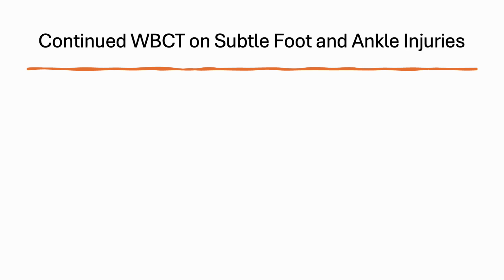What are we really looking for in these subtle injuries? I'm looking at the translation, the rotation, and the area. Those are the three things that I have found in my practice that really make a difference. Is the fibula sitting where it's supposed to be? Is it rotated differently? And then comparing right versus left, is there a different area or volume?